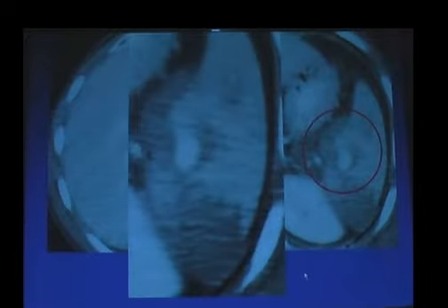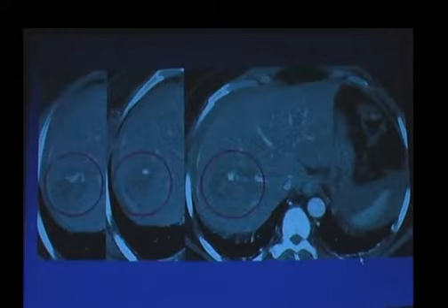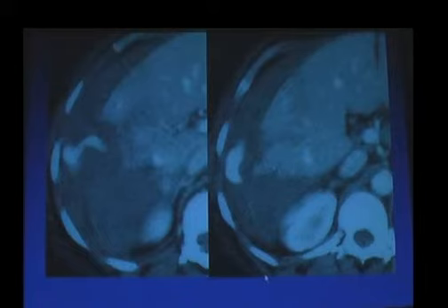This patient had splenic injury. You can see this focal blood clot in the spleen with surrounding hematoma and contusion also in the spleen. This is a patient who had active bleeding into the liver due to liver laceration, and you can see the high-density focal region of bleeding surrounded by lower-density clot. And this is active arterial extravasation in this patient who has fractures in the right lobe of the liver. You can see the bright extravasated arterial flow, and you can see the surrounding hemoperitoneum.